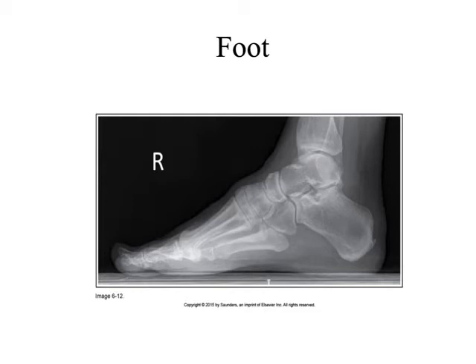Now we can see more or less all those bones that we were talking about earlier. Same kind of requirements of contrast and density. Let's see what else. The talar domes are kind of superimposed here. And we're going to see the distal fibula superimposed with what bone is that? So we have a portion of this bone and then this bone here. Talus? Yeah, talus. Good.